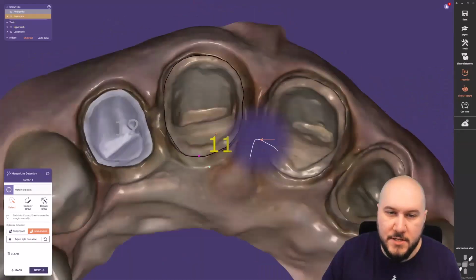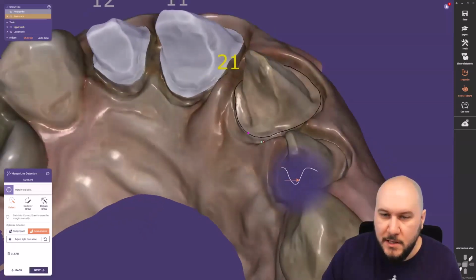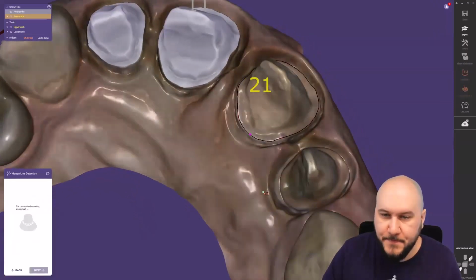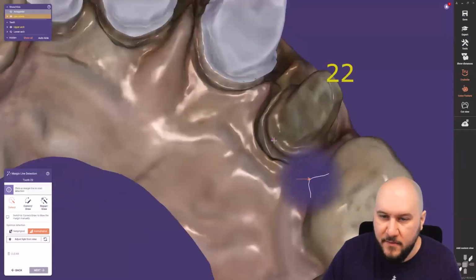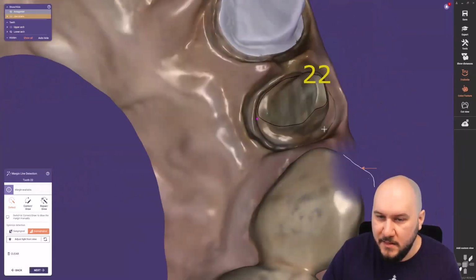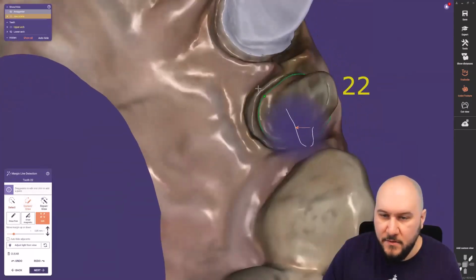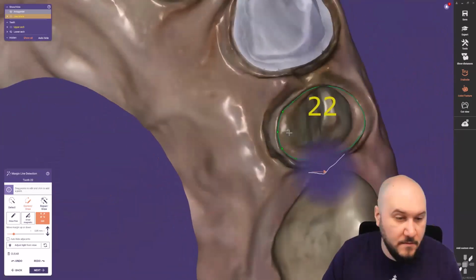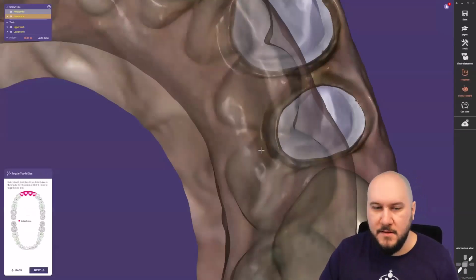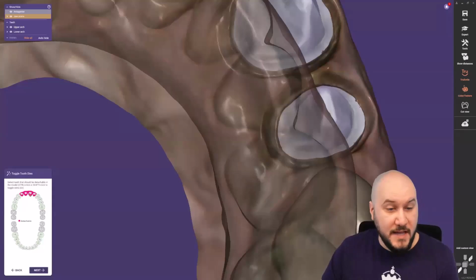I will just mark them normally. Just make one click and the algorithm helps me. Otherwise, if I see something that I have missed and I want to cover it, I can also add more dots, and the software algorithm will try to take them into account. Then I can, for example, add a couple of dots here and make my alignment for the segmentation. Okay, now what you can see here directly is the toggle die system.